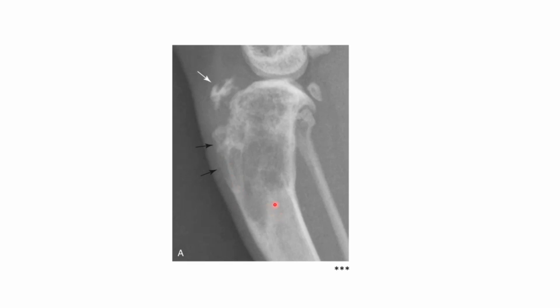The zone of transition here is a little bit easier to see relative to the canine osteosarcoma that we saw a moment ago. So this zone of transition is shorter and clearer than the previous example. And we've also got this periosteal reaction. This structure here could represent an avulsion fracture of the tibial crest as a result of this lesion affecting the proximal tibia and this proximal tibial metaphysis. So this could be a pathological avulsion fracture of the tibial crest.